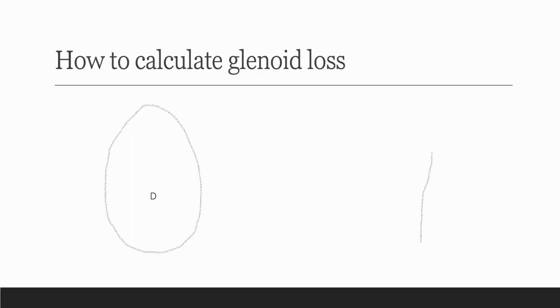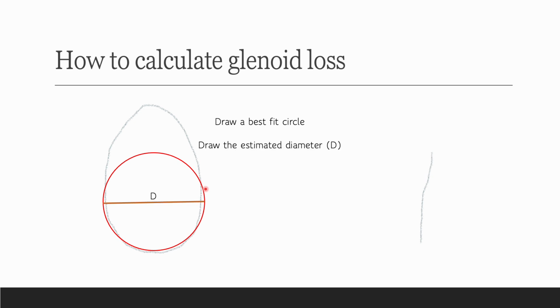So when we're looking at calculating glenoid bone loss, you want to get a good sagittal image of the entire glenoid, where it looks like, some people used to say pear, Donald Resnick calls it an avocado, but depending on what your experience with vegetables is, it looks basically like this. And what you want to do is estimate what the normal diameter of this glenoid is.